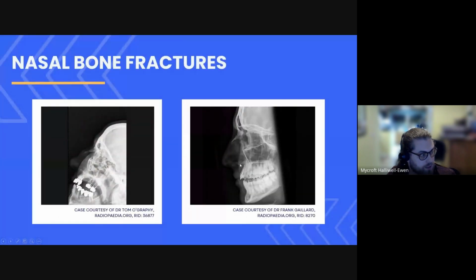Lovely. Right. So really good facial X-ray images, and we can see the nasal fracture. Yeah, really good images. Very high quality X-rays actually. So we can see the nasal fracture really, really well. And that's this bit of the bone, right?